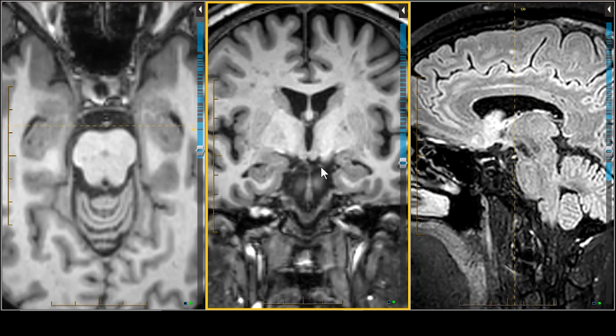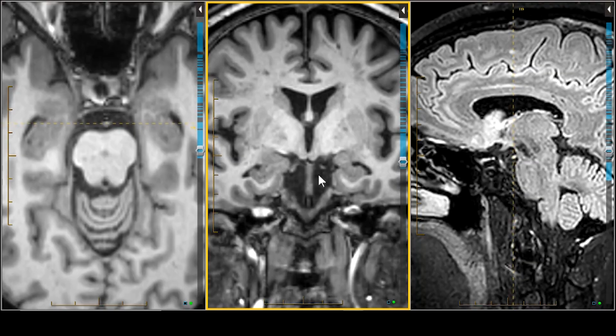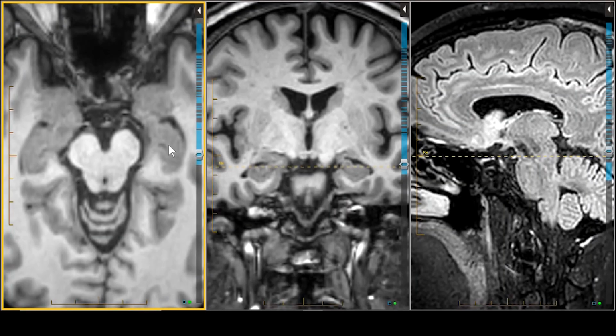So the third nerve is going to come out between the PCA, posterior cerebral artery, and the not so well seen superior cerebellar artery. You can see a wisp of it here on the right, but not so much on the left. This is important because aneurysms in this locus can produce paresis of the third nerve, or so-called third nerve palsy. So I want to give you some tips for isolating the third nerve. One tip is that you've got to have high image quality or high spatial resolution. So thin section imaging is vital to identifying any cranial nerve, and I like to see something on the order of 1.5 millimeters or less.